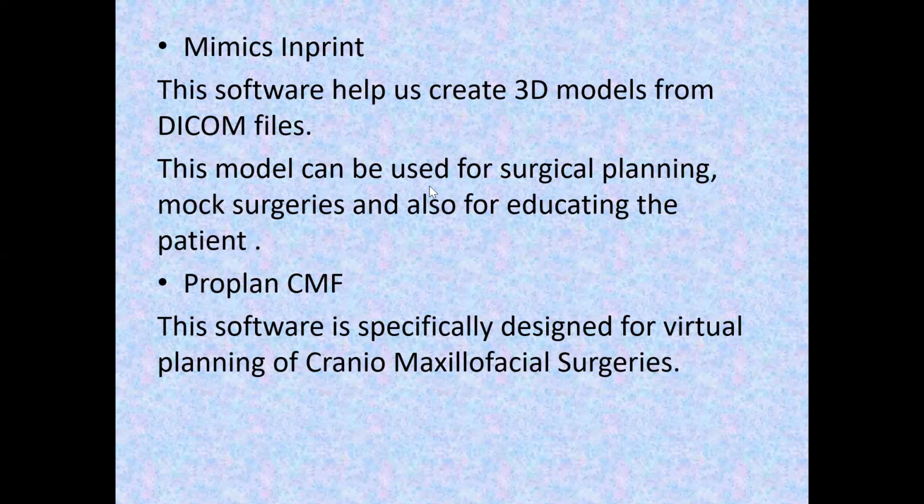Then the second software that we'll talk about today will be Proplan CMF. This software is specifically designed for virtual planning of cranio-maxillofacial surgeries. We can plan osteotomies, fibula reconstruction, and orthognathic surgeries with this. This helps us analyze and modify post-operative results. We can also superimpose cast scans and create splints that can later be 3D printed with the help of this software. Beginning with Mimics Imprint.